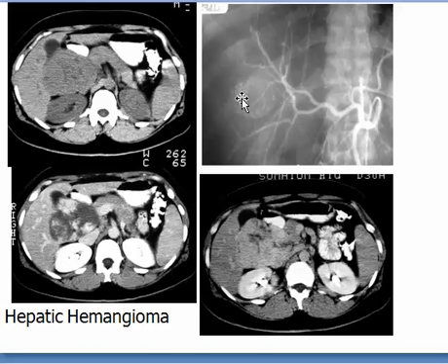Another hepatic hemangioma with the nodular marginal capillary blood pools. This is the mass, this is where the nodules start to appear, and this is how the closing iris sign succeeded in producing a rather homogeneously enhancing tumor, hemangioma.